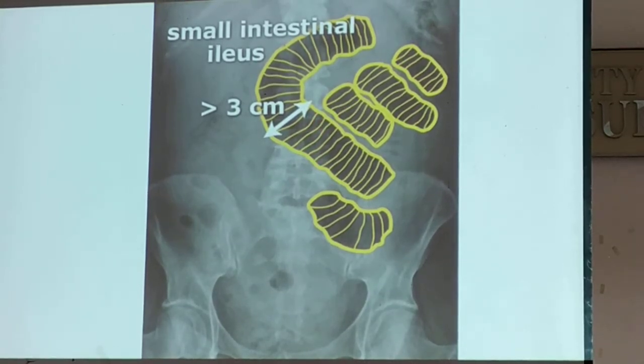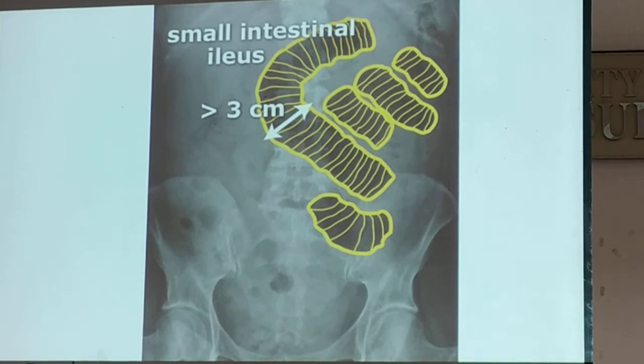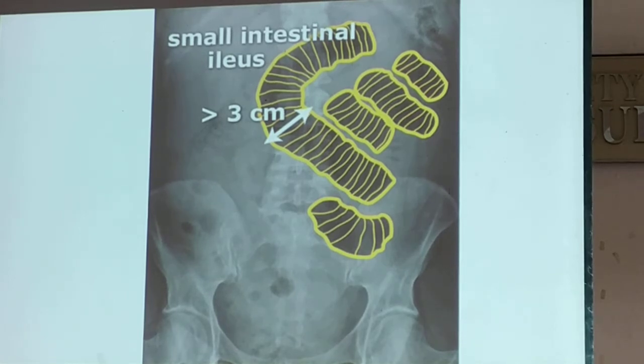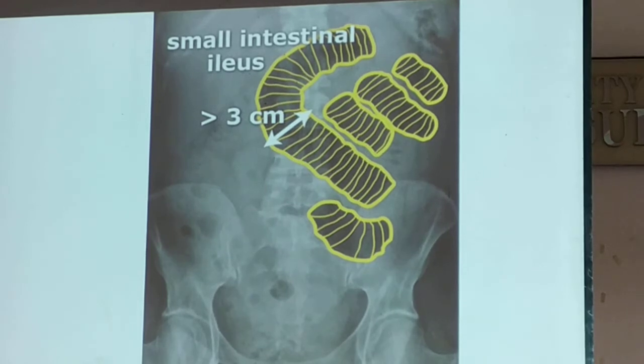Okay? Mas closer ang spacing niya as compared to your haustra. So, if you're going to measure that, you just use your ruler. Talagang, yung 3 cm nun sa ruler, dapat 3 cm din siya radiographically dun sa film. Okay?